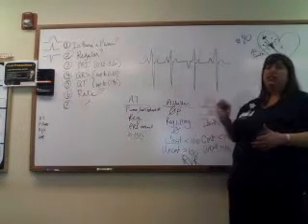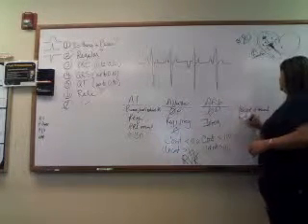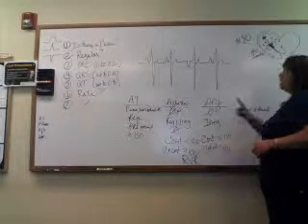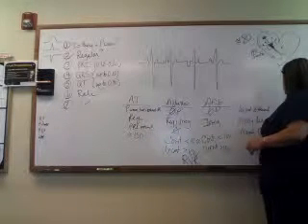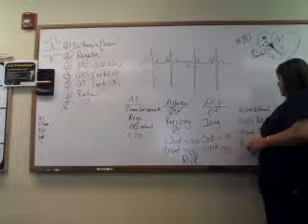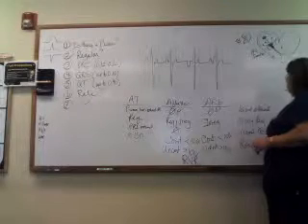If you walked it out, it'll be off a little bit, but it'll be mostly regular. Okay, your PRI should be mostly normal. And then the rate can be anything, because you can have it be higher or lower.